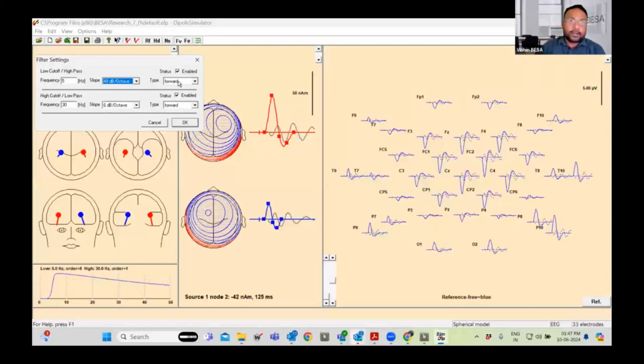So again, when you change the filters to 0 phase, you can see, still it has come back, but the amplitude has significantly suffered. At the same time, you also have introduced new phases. The number of phases has increased from the real and originally simulated data.